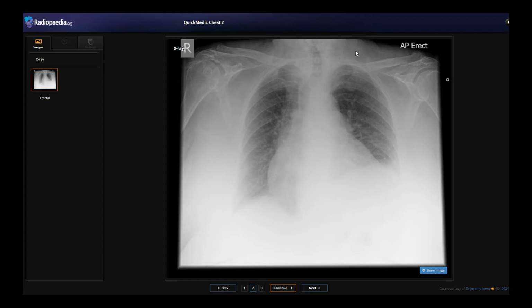So if we do what we normally do, we look at the airway first. We see the trachea. It looks like it's sort of bending a little bit there forward, but you can sort of see a slight translucency here going down. Looking across the airways, can't really see the other side. It looks under-penetrated, this x-ray in its entirety. The patient might be of a large body habitus.